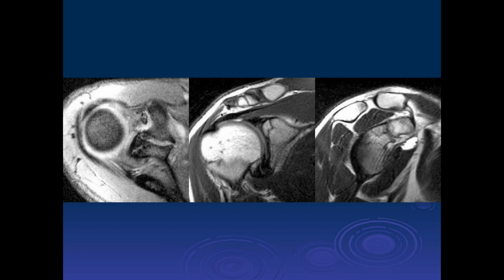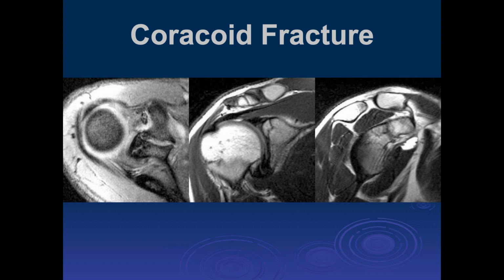Okay, so it looks like this is going to be a young kid because we see the growth plates of the superior glenoid. We also see growth. Is not 20-year-old? Well, it still takes a while for all those to fuse. But we see a defect there at the base of the coracoid and the superior glenoid. So if they're not that young, then that could be an injury, like a coracoid fracture. This was a fracture. Okay.